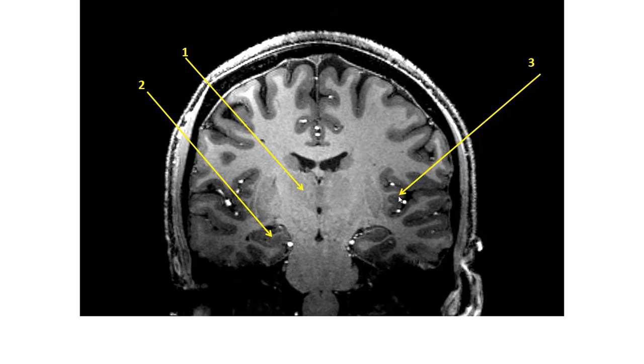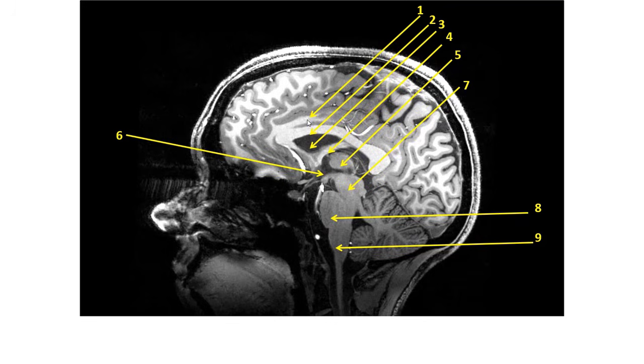Answers are 1, cingulate gyrus, 2, corpus callosum, 3, lateral ventricles, 4, now this is another white matter structure. I said, okay, this is gray, so that's a cortex because it's surrounded by gray matter. That's cingulate. This is white, so that's corpus callosum. This is black, oh, that's got to be lateral ventricles. Inferior to the lateral ventricles, white matter forming an arch, coming from the hypothalamus and wrapping around, oh, that's got to be fornix. And then this is that football structure in the third ventricle, that's thalamus.